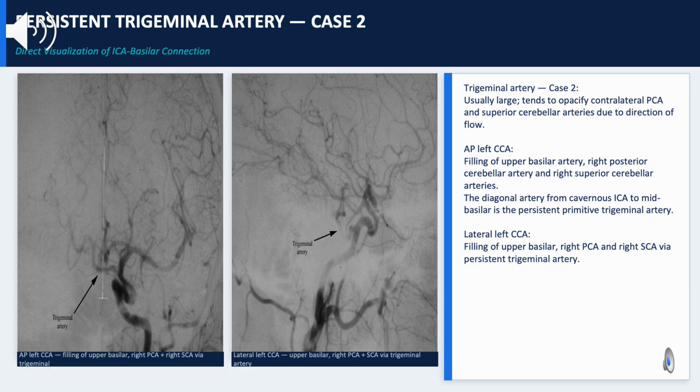On the lateral view, the connection appears as an arching vessel connecting the cavernous sinus region to the dorsum sellae clivus region.